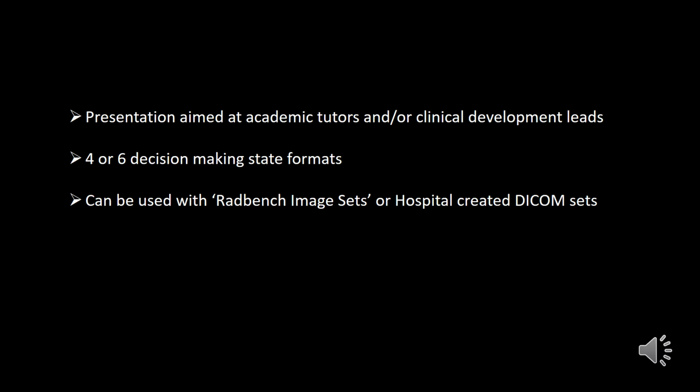These recording templates that I'm going to show you are available in either 4 or 6 decision-making format. They can be used either with the RadBench image sets, or you can create your own and just link the RadBench recorder to your own image set. I'll explain that as we go along. At the moment, these tests are only available in English and French languages. We are hoping to make Swedish and Portuguese in the not too distant future, but at the moment they're just available in English and French.